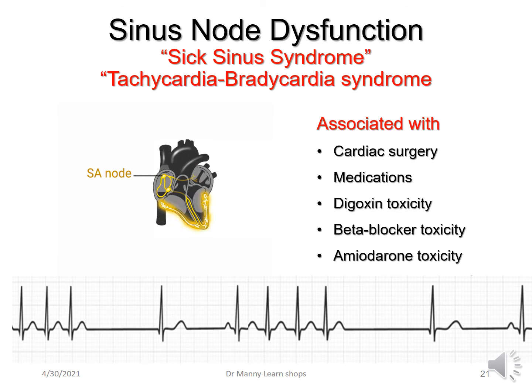This is sinus node dysfunction. And sinus node dysfunction was a term that was introduced many years ago in place of sick sinus syndrome, which can also reflect the Tachycardia-Bradycardia syndrome. They all basically mean the same thing. The sinus node isn't working properly for some reason.